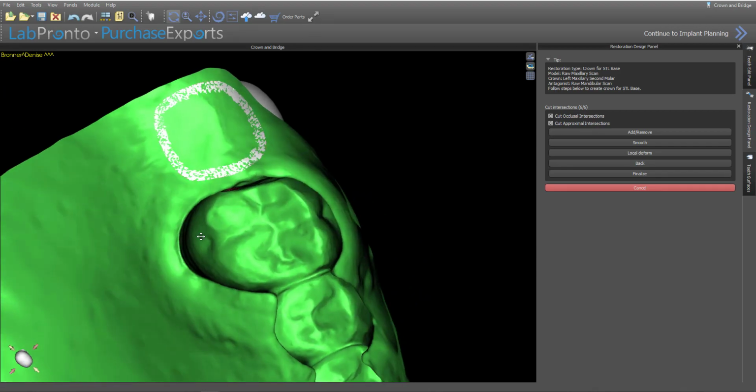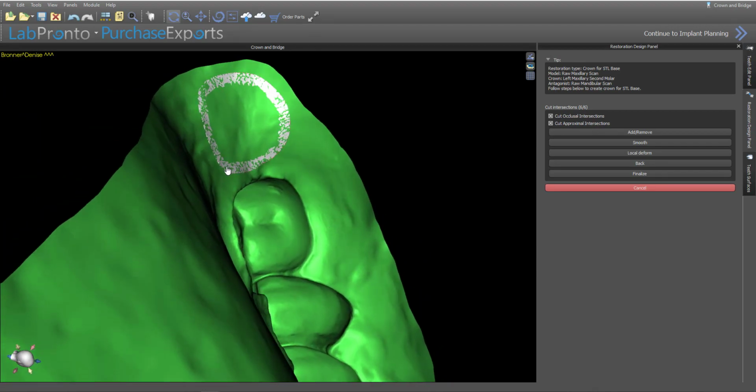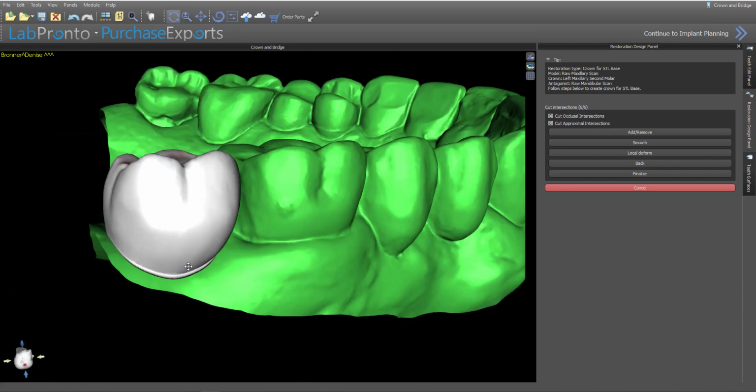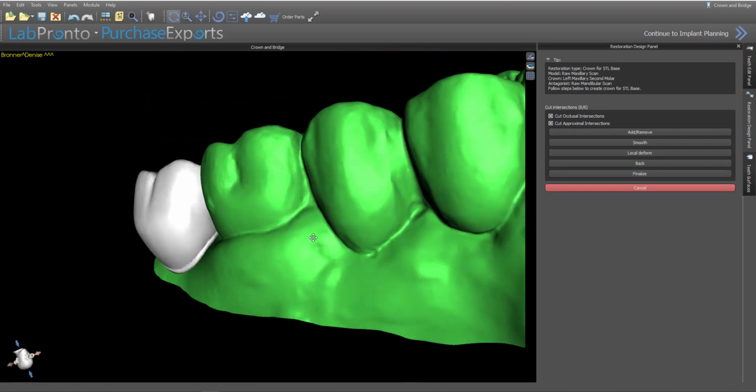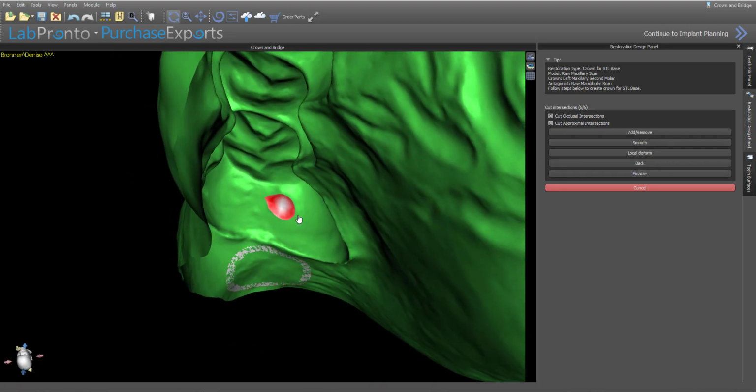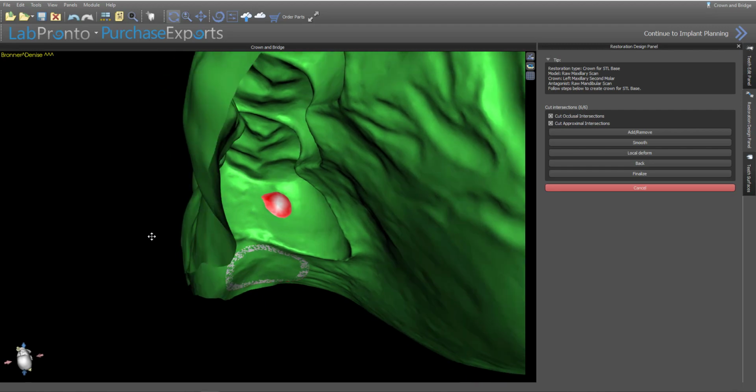So you can see here, the white that's shining through, that's your zero cement gap. Again, it builds it as if this were a typical crown. But we essentially have what we want at this point. All right, we've got a slight impingement here in the proximal contact.